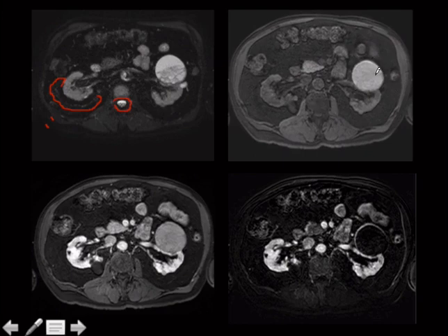So if we just looked at the post-contrast, is that bright because it's enhancing, or is that bright because it's intrinsically T1 bright? It's hard to tell, right? So the computer does some math and subtracts out the pre-contrast intensity, and what you're left with is whether or not there's actual enhancement there.